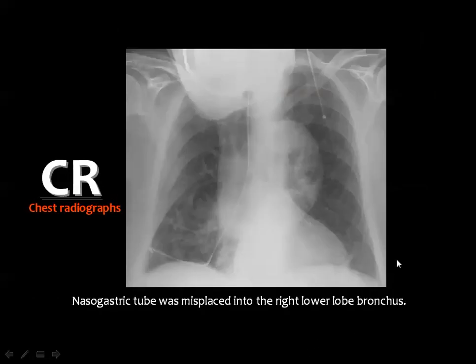Then the patient position will also affect the radiographic projection. Sometimes you are not able to elevate the patient's neck so that it will not cover part of the apex of the lung, and there may also be some tilt of the X-ray tube, inevitably tilted, so that the projection is not the optimal one.